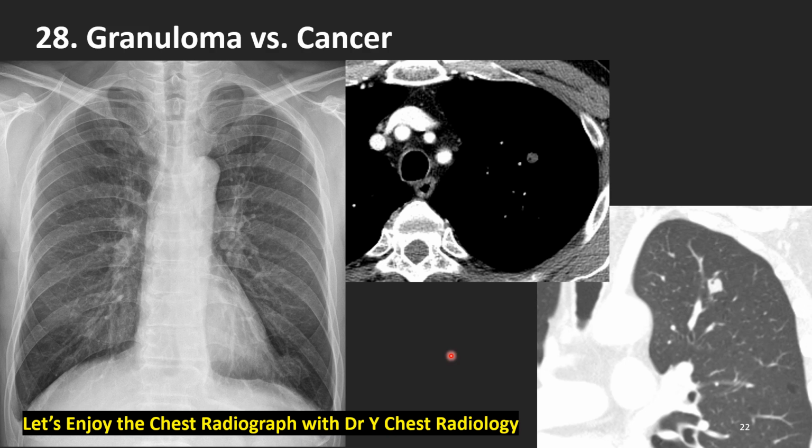5% of active tuberculosis patients manifest only with nodule, named as granuloma. Only finding is this 1 centimeter granuloma nodule, nothing else in whole other lung. No lymphadenopathy, no micronodules, no tree-in-bud pattern. Only this nodule on X-ray and on coronal image here. This was confirmed as tuberculosis.